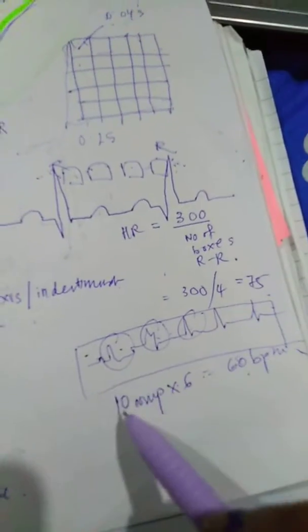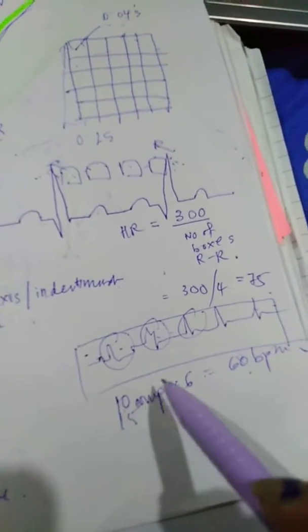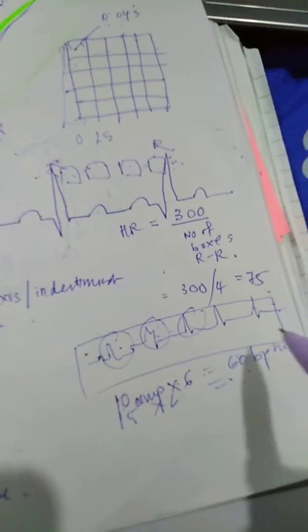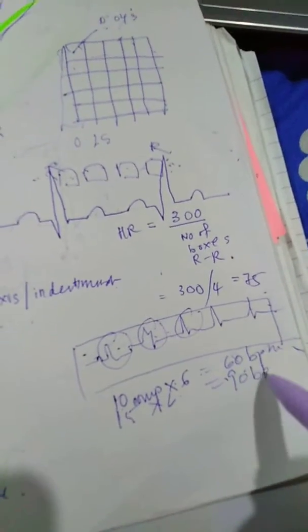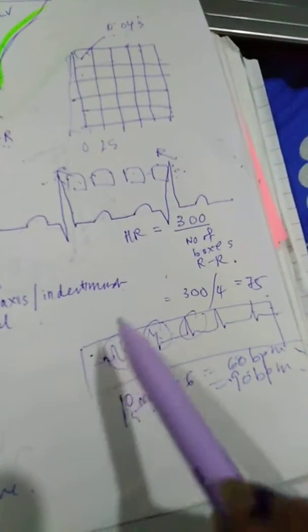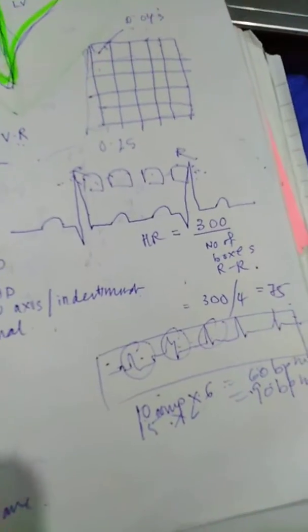All right. So let's say the patient has 15 complexes along the 10 seconds, so 15 times 6. So you get around 90 beats per minute. 90 beats per minute is still fine. Right? So this is how you actually calculate if the patient has an irregular heart rhythm.